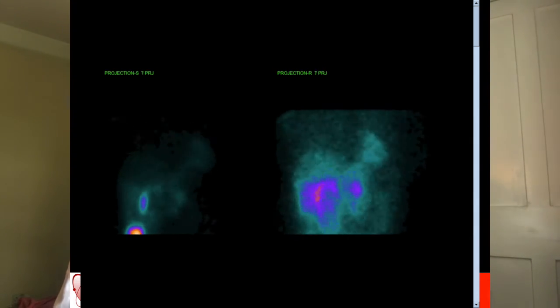The CT scan showed an Agatston score of 2, and specifically in the report they said there was artifact across the diagonal, but there was no other coronary artery obstruction. So the question today for the MPS is, is there reversible ischemia? The patient's BMI was 30 and her bra size is 38D. So we review the raw data.